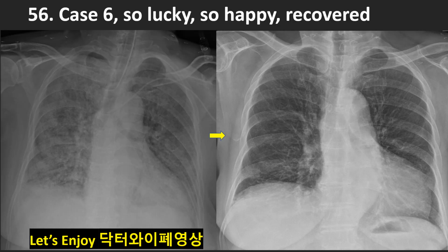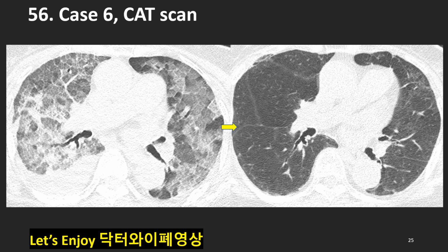However, sometimes we see this kind of result, the best result. She became almost normal after good treatment, became good condition. She was lucky and her doctor was very wonderful. Thank you, doctor. So lucky, so happy she recovered from ARDS. This right side CT scan shows how lucky, how healthy she is now. Sometimes ARDS can be better and cured.